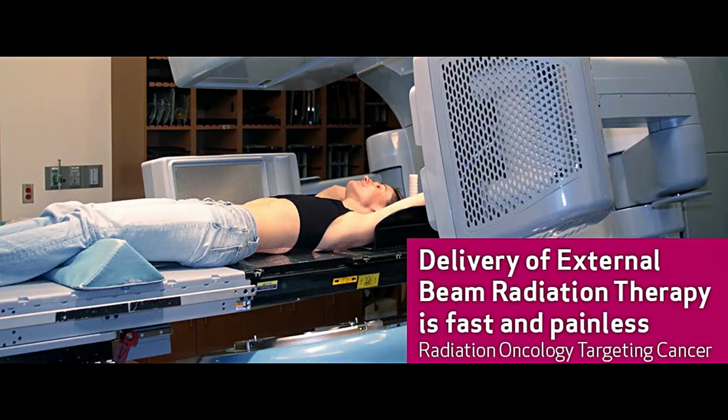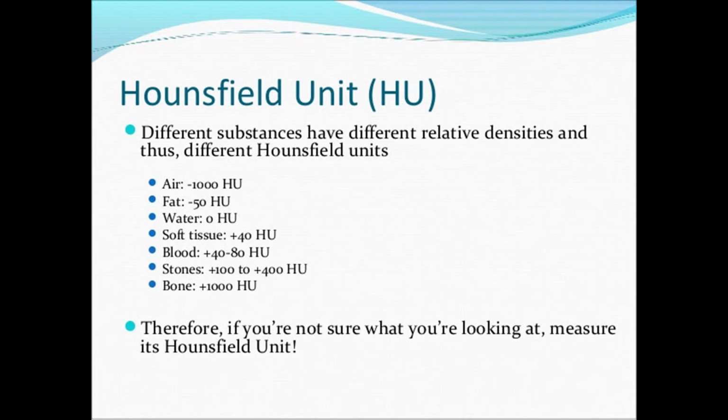Once the patient's had their CT scan, we import it to our treatment planning system, and it's very important that the patient has a separate planning CT scan. One, because we need them in their treatment position, so that the plan we calculate is going to be representative of what they're receiving on the machine in the same position. And two, it's getting a little bit physicsy, but the specific Hounsfield units, or the density assigned to certain structures, is dependent on each individual CT scanner. So that one CT scanner's information will be in our treatment planning system.